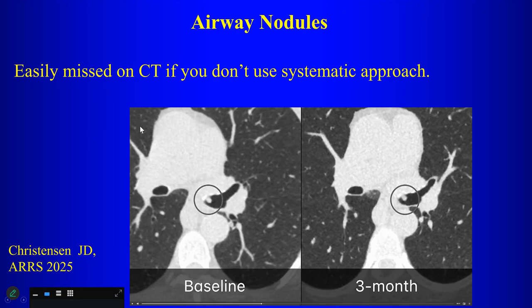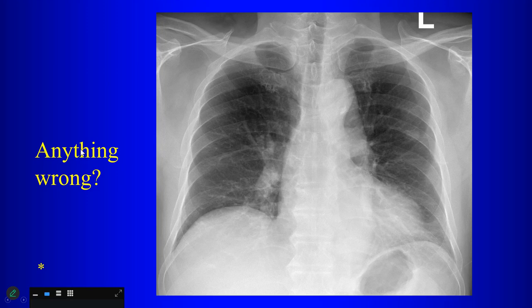Now, having said that, we've talked about CT a little bit, the rest of this, we're going to talk about plain films, what you need to know about plain films, okay? When we look at this x-ray, anything wrong?